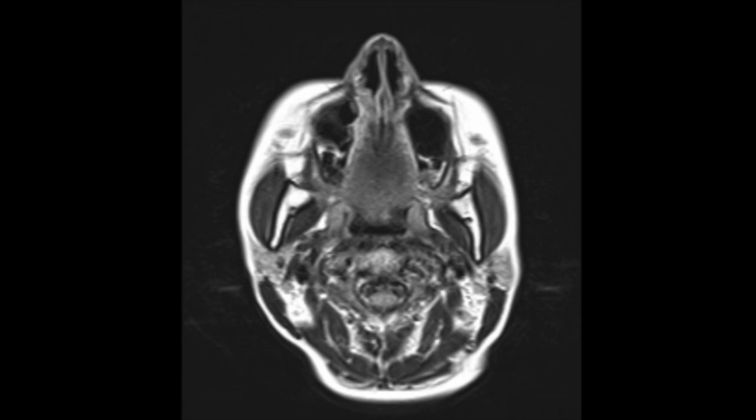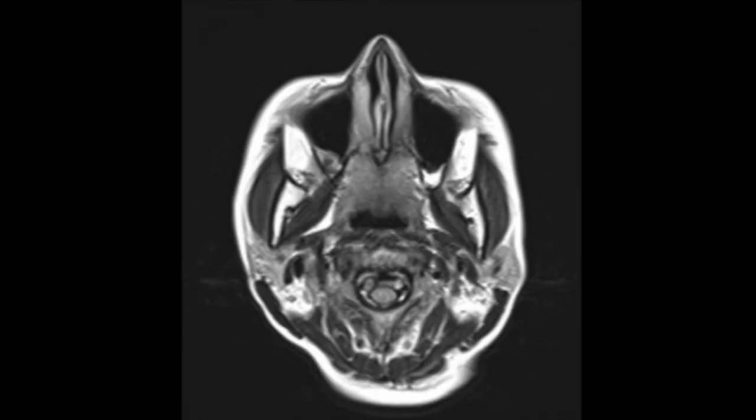This is Okiraku-Radiology. Let's take a look at another case today. First, I'll run through the images quickly.